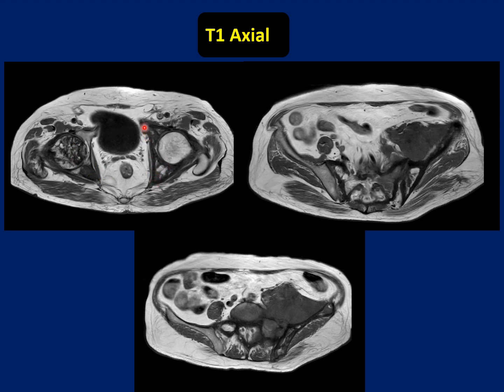There is thickening of the cortex, disorganized bony trabecula, and the cranial section shows a well-defined T1 hypointense mass lesion just anterior to the left sacral ala involving the left iliopsoas muscles. Here we are able to see evidence of bone destruction, or the cortex is not clearly maintained when compared to the cortex which is seen here, as well as in the right sacral ala cortex which is noted here. The left sacral ala cortex is appearing irregular, and there are areas of bone destruction which is noted here.